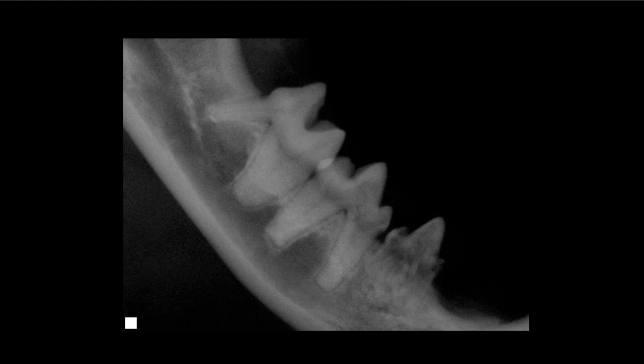So obvious on the third premolar, we've got replacement resorption with bone. There's no root structure there that's visible. It's all bone replacing the tooth root. The crown's affected. The margin where all that inflammation was grossly is causing all that inflammation there where the crown has been dissolved and the gum is growing into that.